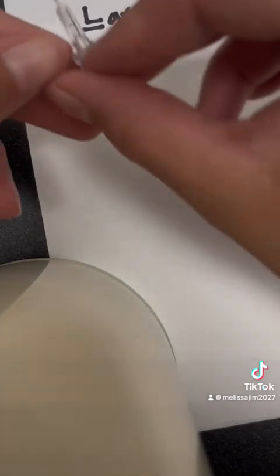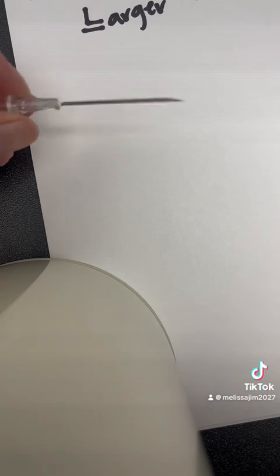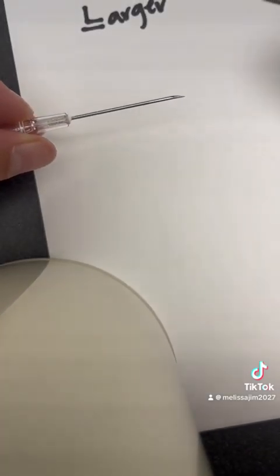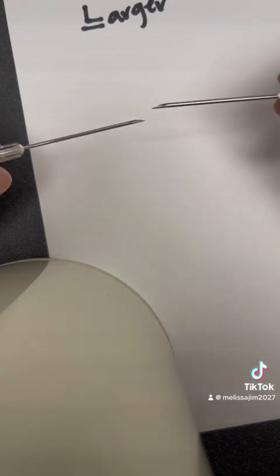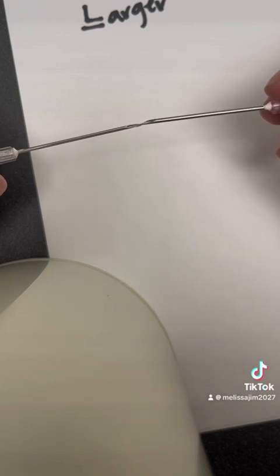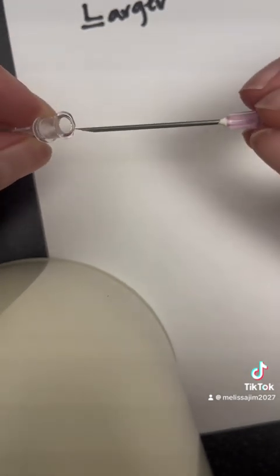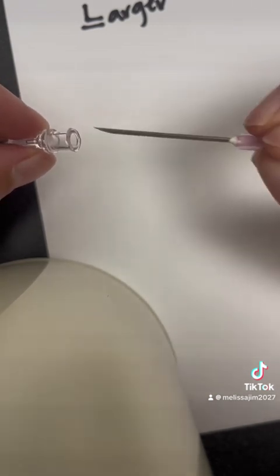And just a little review on our needles here. So we have our needle shaft here, this metal bit. And then really important bit we need to make sure we know where it is, our bevel. So that's just the opening of our needle here, that little hole. And then we have our hub and then our hub opening. Okay, so this is where we would lock in our syringe.